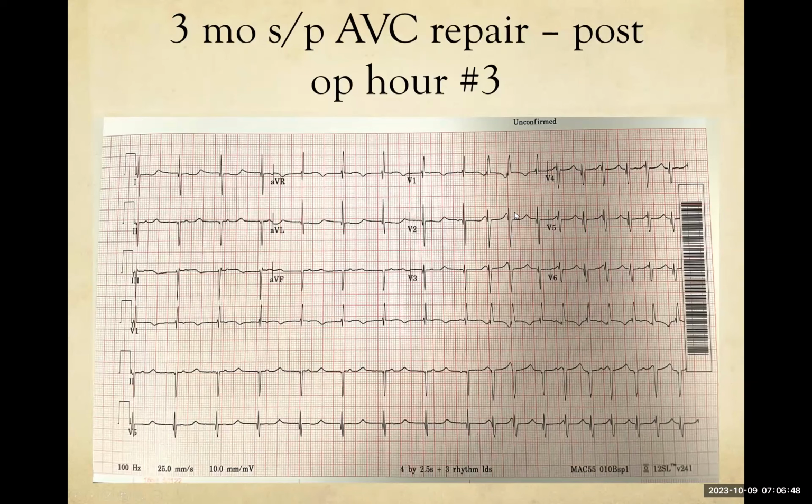Now, so Christina, if you saw this rhythm and you saw this patient at post-op hour 3, we want excellent cardiac output. So this, I think we'd all agree, this heart rate is too slow. This heart rate, this dissociated faster rhythm, the rate might be okay, but the rhythm not so much. So how might you treat this, do you think? You can pace this patient. Pace, okay, I agree with that statement, but I'd like a little more detail in the answer.